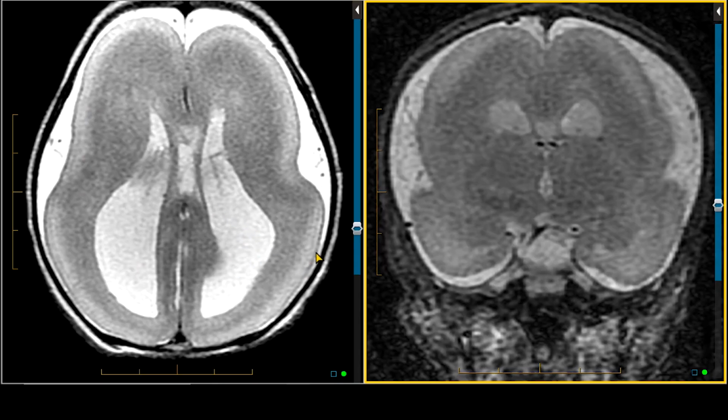On the brain, we're actually seeing something that we saw in the other cases. We saw the peripheral cortex. We see a cell-sparse zone that's bright on T2-weighted imaging. And then we see a band of gray matter-like substance called gray matter heterotopia. So this is a very severe case of Lissencephaly with band-type heterotopia.